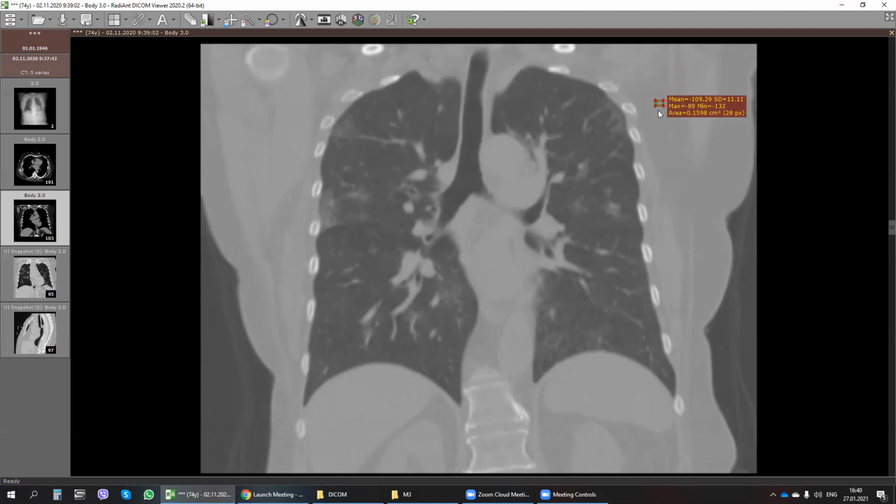If we place over the soft tissues, over the fat, we can see that minus 100. Over the parenchymal organs like spleen, 38 Hounsfield units, over the liver, 43, and so. And if we place over the bone marrow, bone medulla, it's 133. Over the heart, for instance, 43.